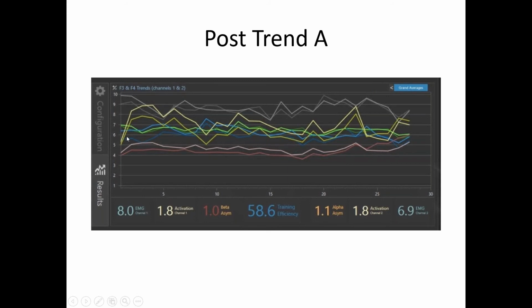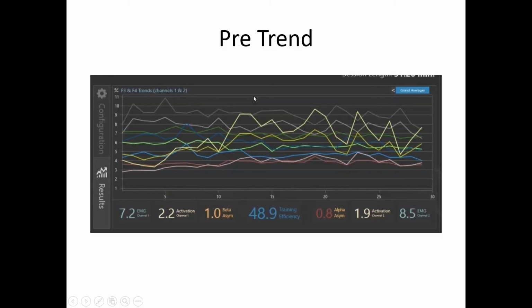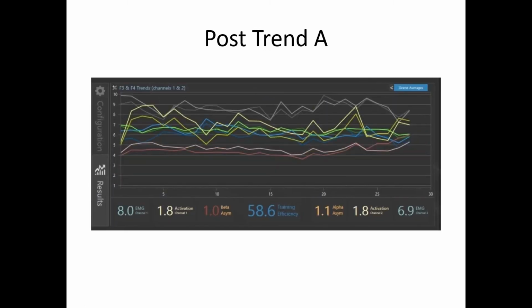So this person's ready for, last session was a little tough to get through. I'm bracing for this one, and then I'm going through reorganization phase transition. I'm starting to integrate, and then I'm getting, okay, I think it's safe here. And we're seeing the two deltas come together, the two thetas, the two alphas, the two betas. You can see a real clear difference between, oops, this and this. That's reducing noise in those neural networks. And the neural networks are homotopic, whether you read Menon, Honey, Meehan, and Bresler, I don't care who you read, and whatever imaging protocol they're using, it's well established at this point.